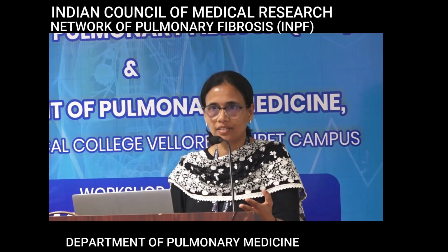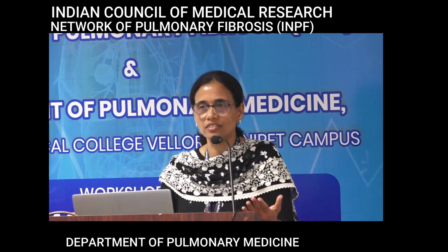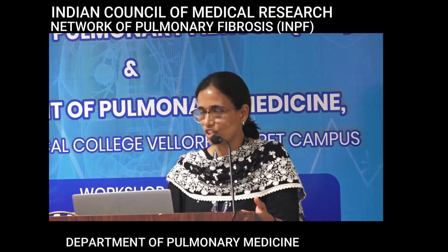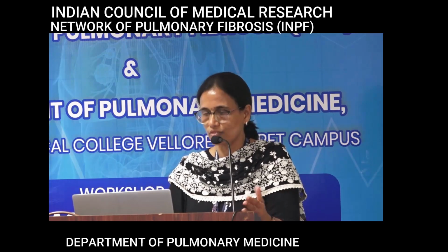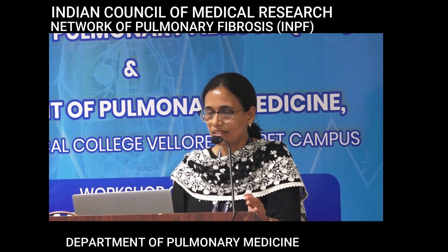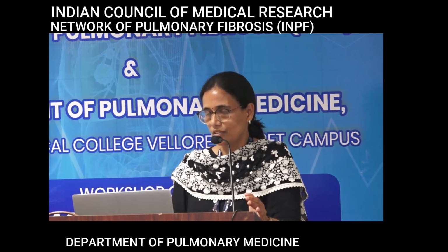And if I say a patient has pigeons in the house, what is this? It is a hypersensitivity pneumonitis, all right? Non-fibrotic. We didn't see any fibrosis, we're just seeing the centrilobular ground glass density nodules. Similar pattern, but a little less obvious, but we can see faintly some nodules here. So this was a smoker and respiratory bronchiolitis.